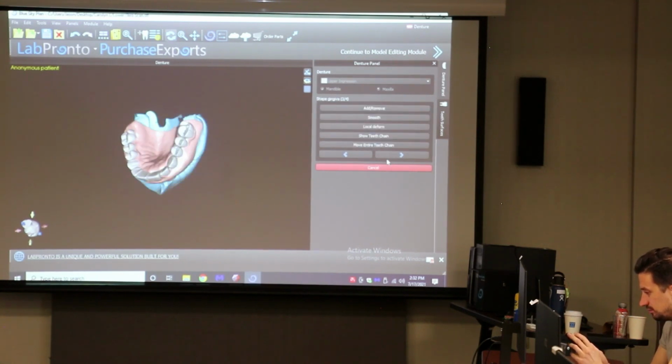Okay, so the goal is shift click and do small little increments all the way around, like that. And so go all the way around in small little chunks here, being careful as you cross over, and that way it doesn't get too offline. That's okay if it's just kind of set off like that. Don't worry about that too much. Even if it kind of looks like it's going through there, it's not a big deal. And you're just going to follow all the way around.